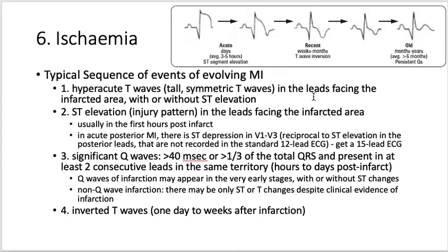As the infarction progresses without any meaningful intervention, what you would expect to see is some progression of ST elevation, once again in the leads facing that infarcted area. It can then sometimes present as depression and then elevation. And this usually is happening in the first hours post-infarct.